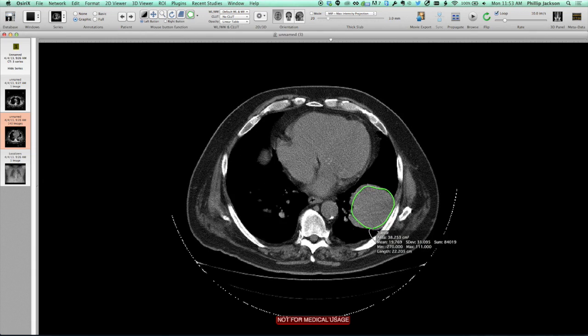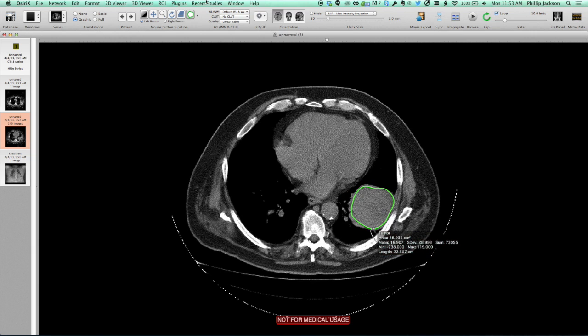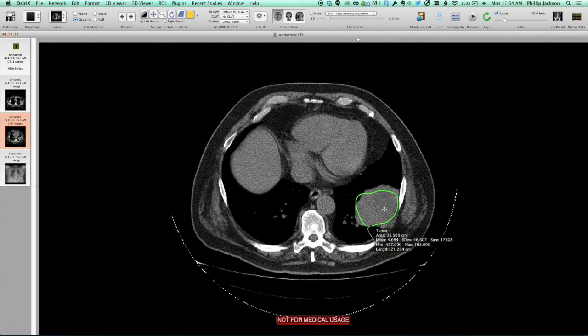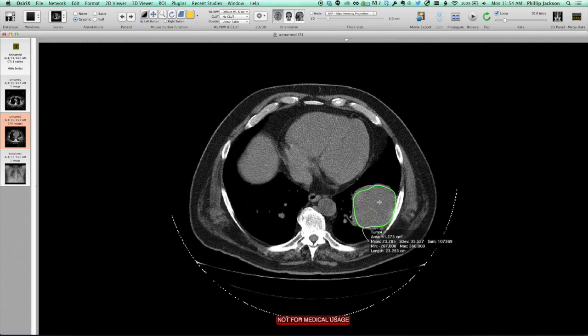Now, computationally, it's generated a best guess. We can tweak these ROIs by using the repulsor tool. And we just simply click down and drag our repulsor tool around the ROIs. And you'll notice that we can get them to be better established around the tumor. And we can do as much cleanup as we'd like here. If we're just looking for a general volume measurement, not necessary to get super detailed, we'll go ahead and stick with that for now. Fairly accurate representation of the tumor.